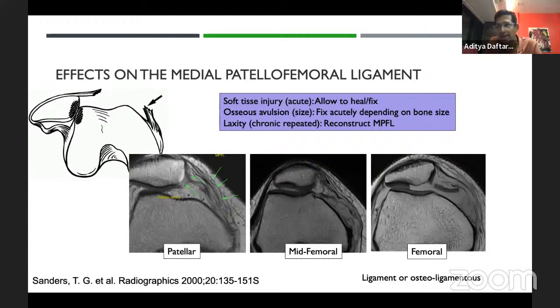So you'll know this is not hyaline cartilage. But a T2 map is a way of giving you a little bit of extra oomph to tell you that, yes, this is hyaline cartilage, or no, this is not. Can we quickly see a few patellofemoral cases? Yes, we will look at that in a minute.